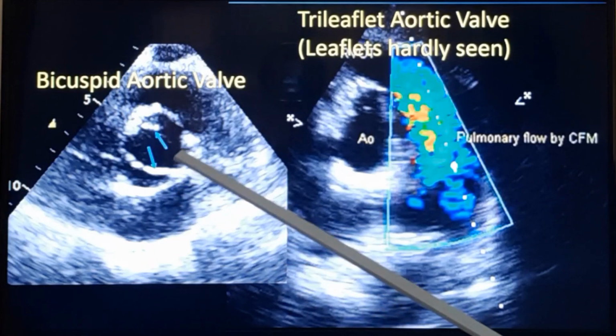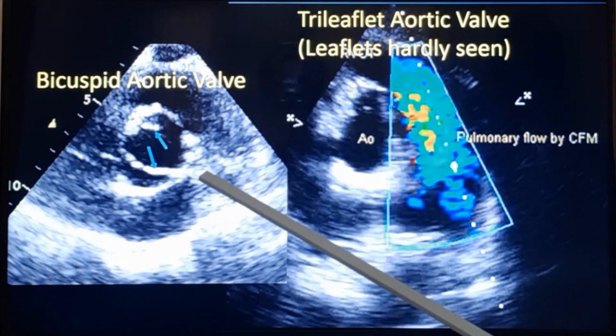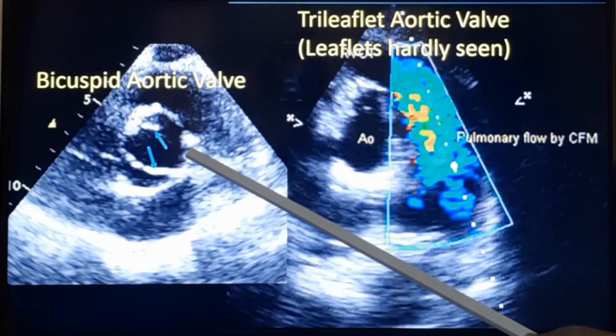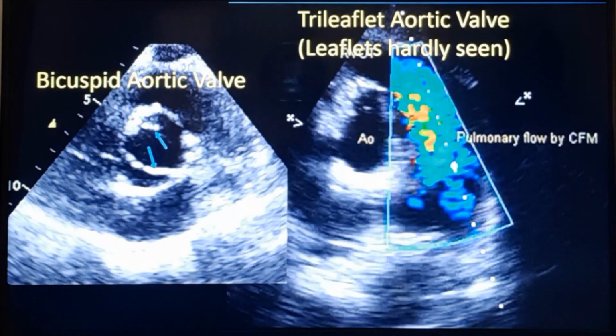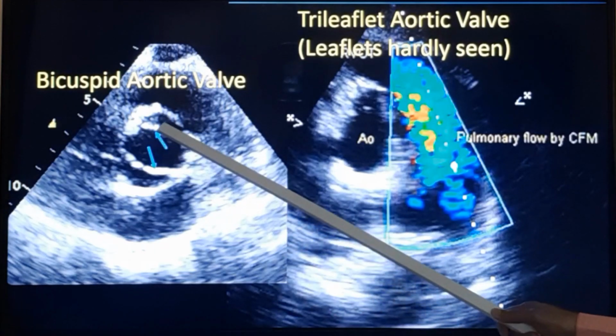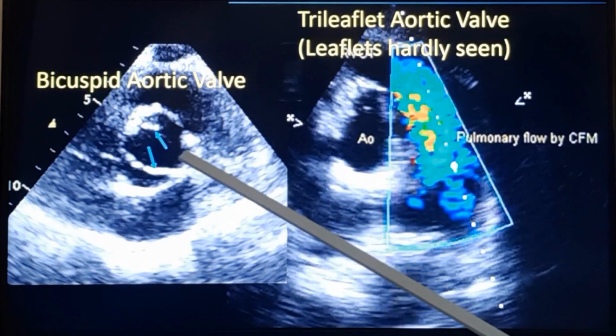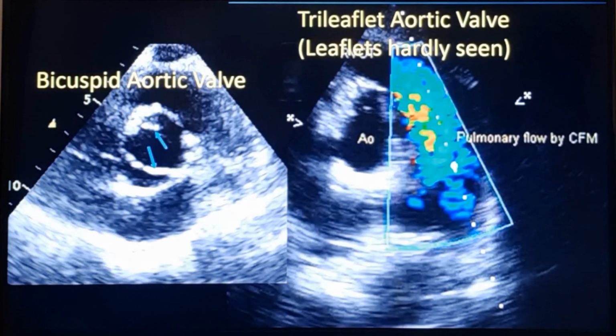And this is the corresponding echocardiogram in bicuspid aortic valve. You can see two leaflets. So you can understand that bicuspid aortic valve is intrinsically somewhat stenotic because the leaflets are not actually touching the aortic walls, and this is likely to be regurgitant also, because bicuspid leaflets are likely to have both stenosis and regurgitation, and both can progress as age advances, so that they may present with aortic stenosis most often in the older age group.